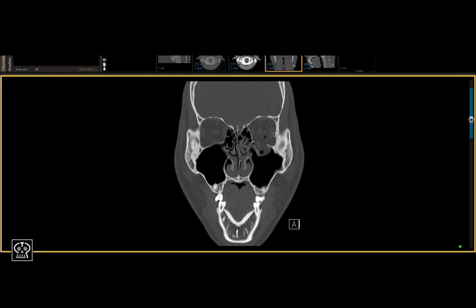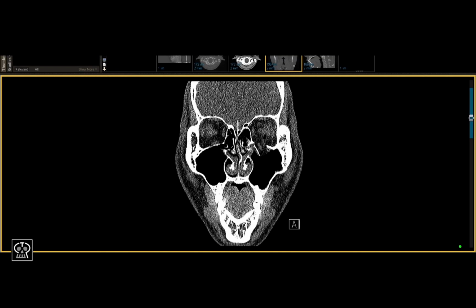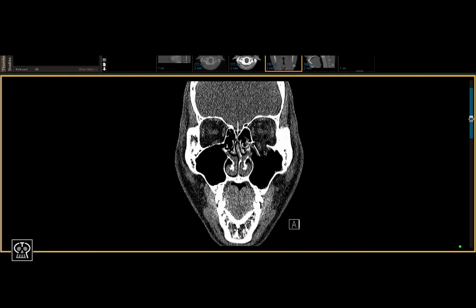As you can tell, you can see faint outlines of the muscles here in the bone view. But if we switch to another view, for example, abdomen, pelvis, or head and neck, it becomes much easier to see these muscles. Here we can see our fractured bone, and we can see the inferior rectus right here. Although it has been downwardly displaced, there are no signs of entrapment.